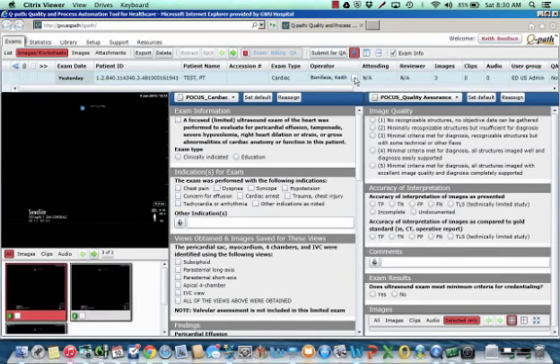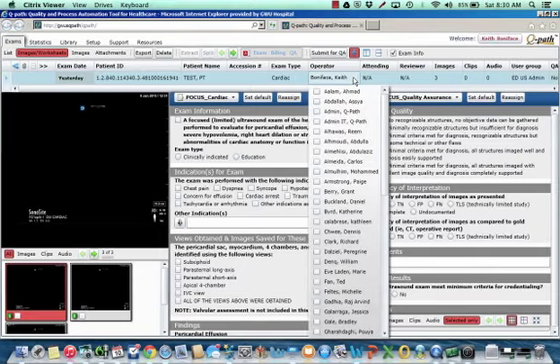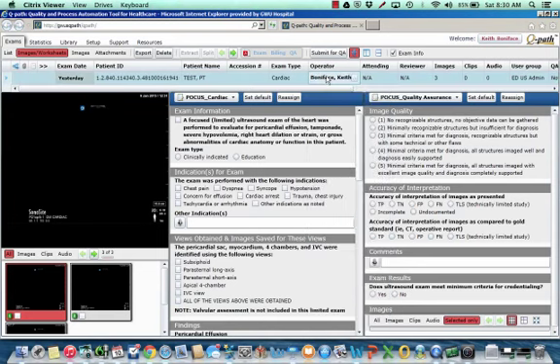Now, say I had someone else with me, Kat Calabrese was scanning with me. I can click back in this box here and I can add a second person here by adding Kat here. I can add Todd Clark. This will show up on all 3 of our Qs.